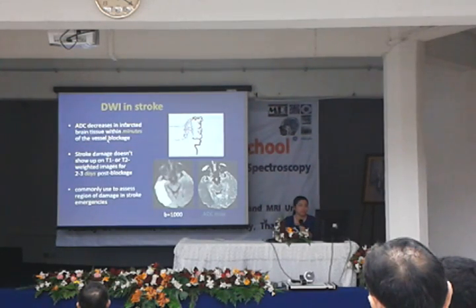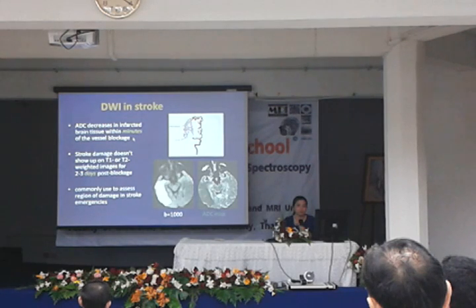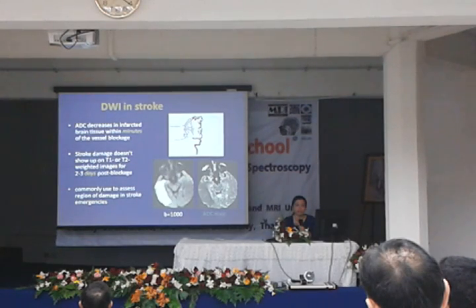For stroke patients, DWI is a very useful imaging tool that can show the lesion within minutes after a brain attack, very fast to detect the abnormal finding. When there is a blockage of the vessel, the brain lacks blood supply, and the tissue at the core, the center, becomes dead tissue. The surrounding tissue that we have to identify is called the penumbra.